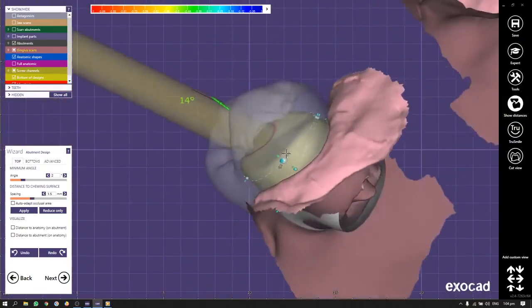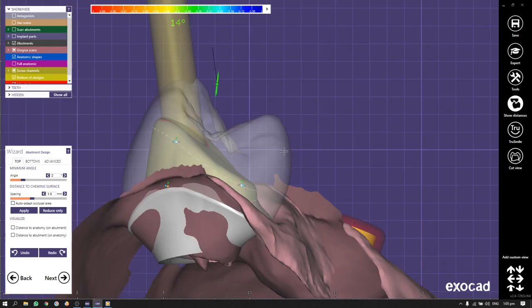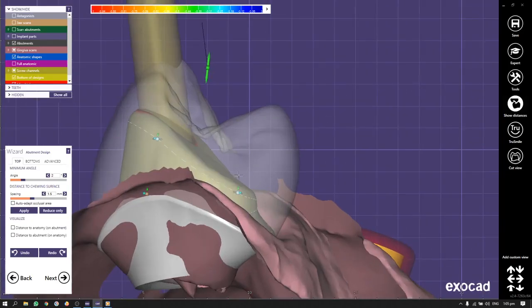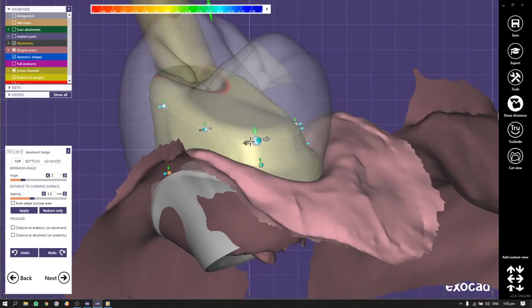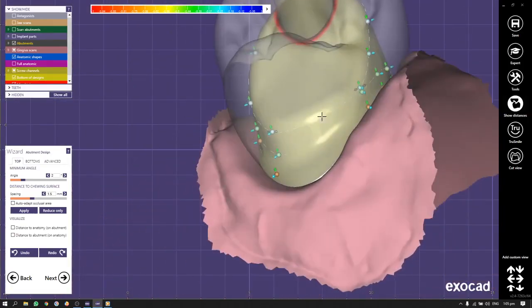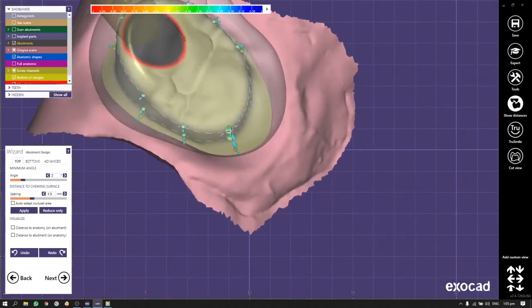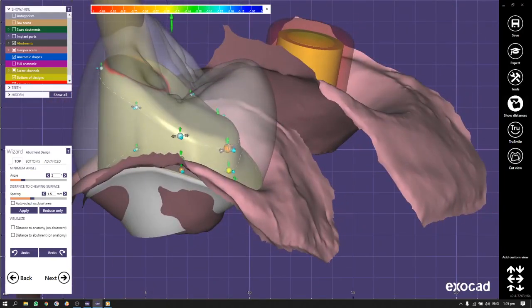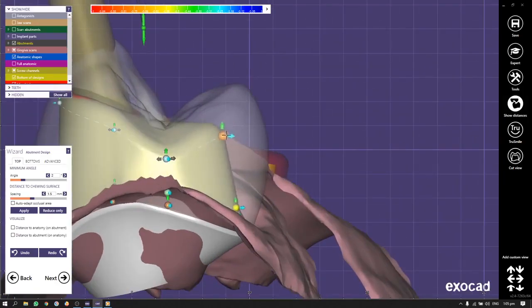It looks like it. So what kind of buttons we have for the manipulation? With the help of left mouse button and the wheel, with the control and the wheel, we create new dots. With the left mouse button and right mouse button, we remove these dots. Once again, control, left mouse button, we create dots. Left and right mouse button, we remove these dots. If we hold with the left mouse button on the upper part, I will raise it in height. If I hold it from the side, we can change the inclination of the walls and may expand them.